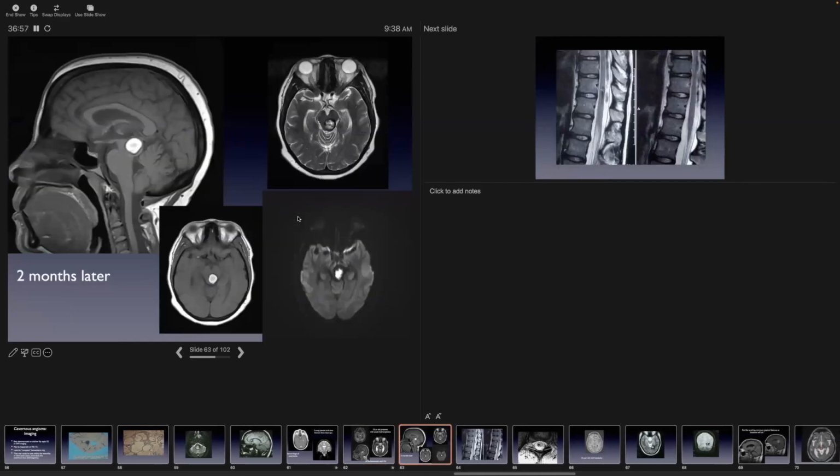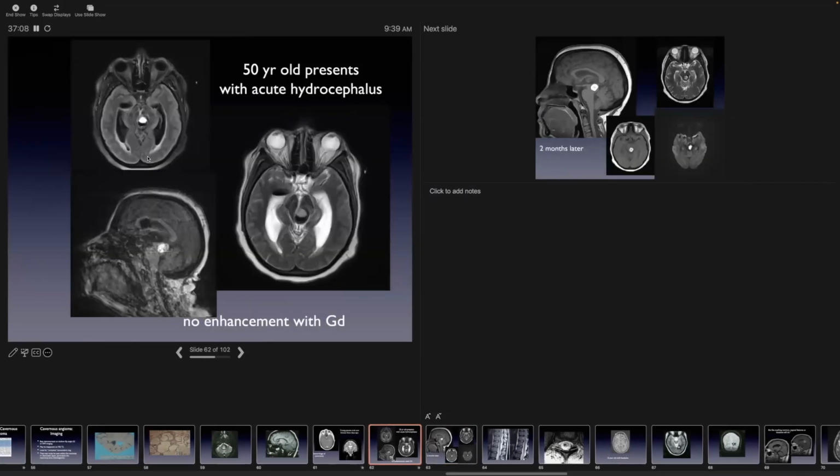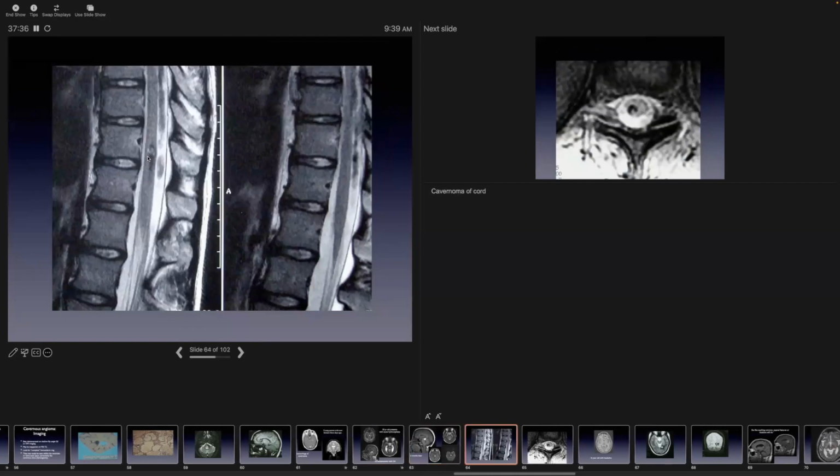So the surgeons chose to follow this case. Now you see as the hemorrhage resolves, again, there was no abnormal enhancement, but it takes on the appearance of a more typical cavernoma. And we followed this, and it actually regressed over time. And this was a tectal cavernoma. And the patient was spared the potential morbidity from surgery of this lesion at the outset. So again, when you have unexplained hemorrhages that are angiography negative for vascular malformation, particularly when you're dealing with the brainstem, you want to at least consider the possibility of a hemorrhage in a cavernoma.